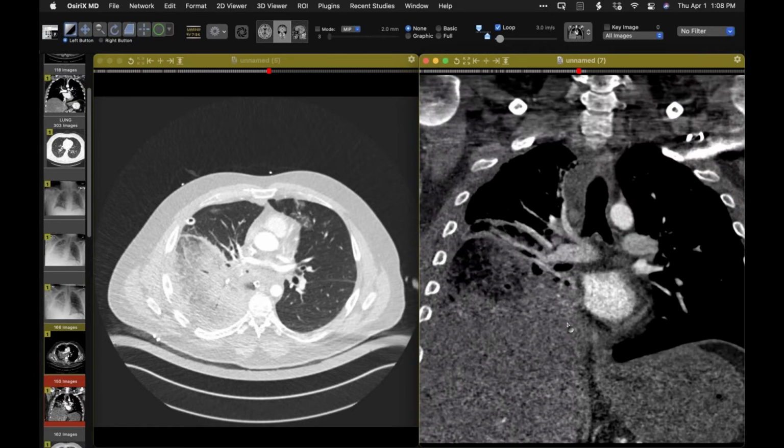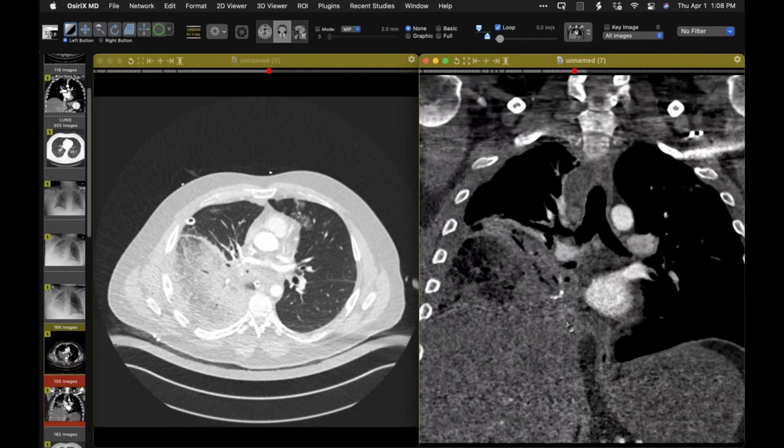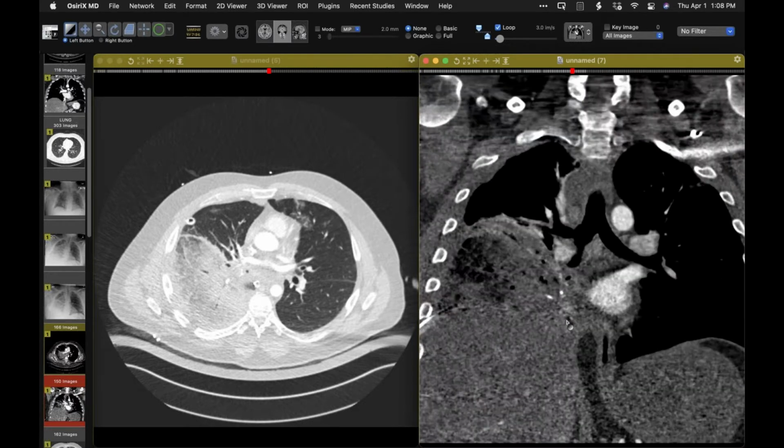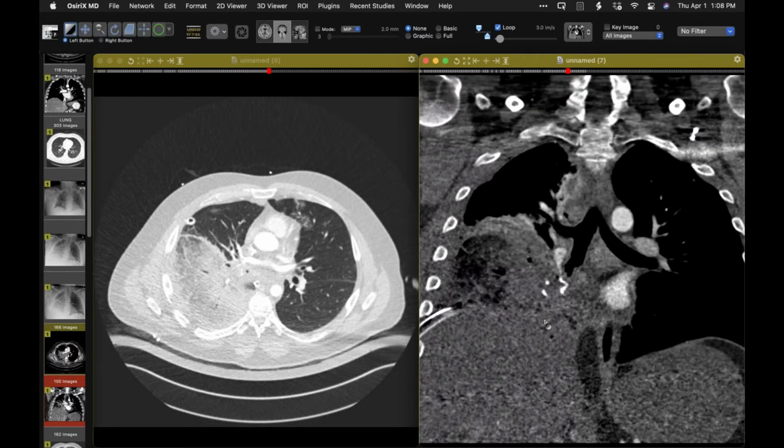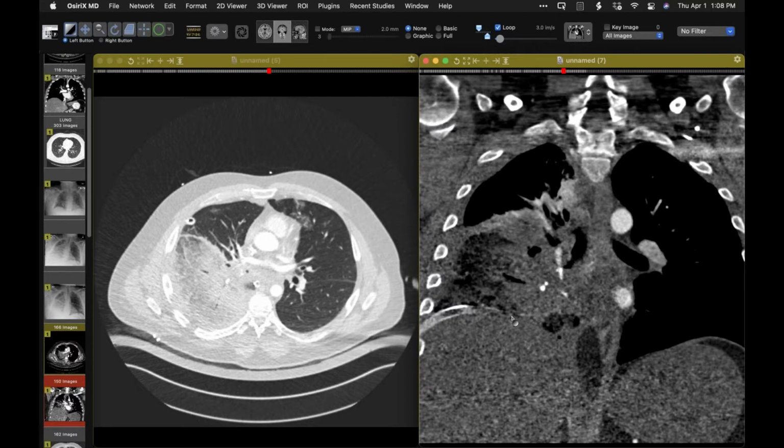And if we look for any blood flow through the lung to the pulmonary veins, we see staples, but we don't see any blood flow going through there. So this is very consistent with ischemic injury to the lung, undoubtedly pulmonary hemorrhage. How much actual infarction is present is unknown at the time.